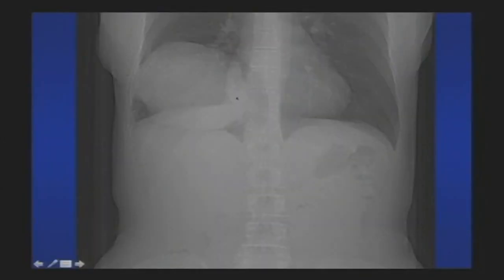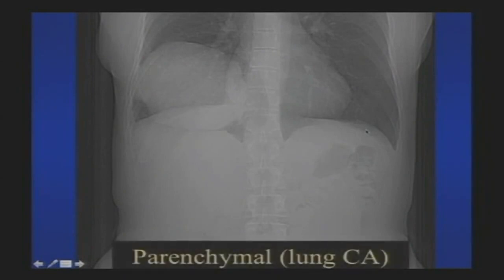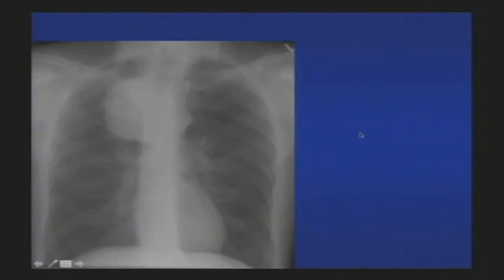Here's something that's not a breast implant, believe it or not. This is a big, huge lung mass. Looks round. We got multiple acute angles where it touches the pleural surfaces, very well defined. Silhouette sign tells me this is going to be a lower lobe posterior lesion because the heart border is intact and the dome of the diaphragm are intact. That was a big lung cancer. Okay? Distinguishing a lung versus an extrapulmonary lesion is not as accurate for big masses.